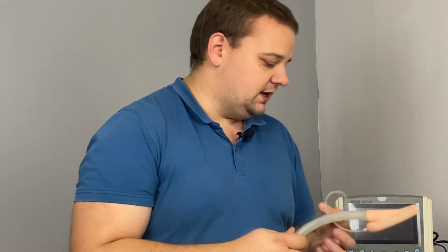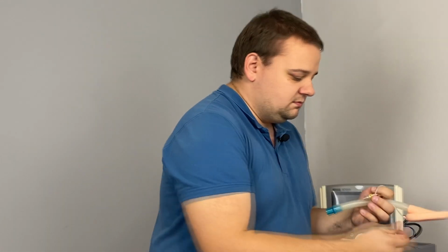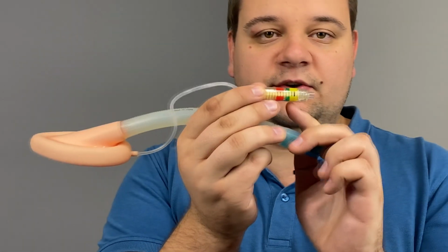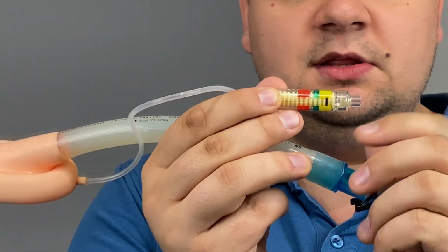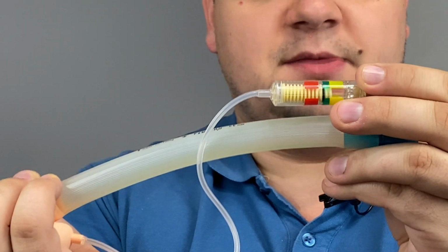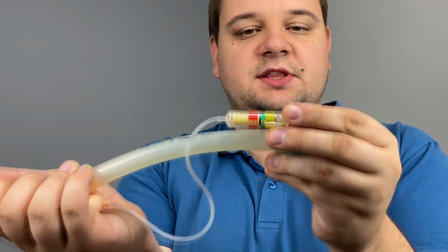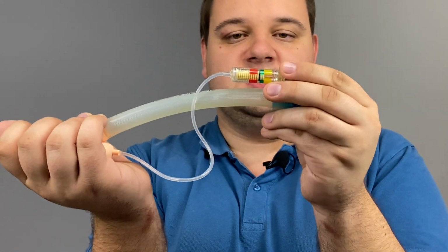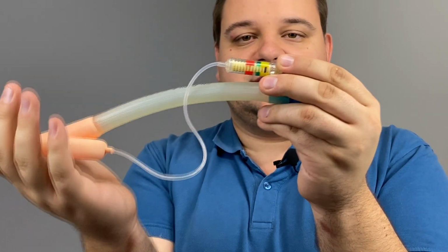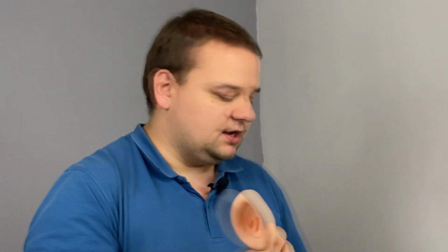Also, our mask has a unique feature which allows us to use it more securely. So this is a pressure controller, and you see that it has 3 colored levels. So green is the ideal where we are going, and when we start to inflate it, when we're inside the patient, so let's imagine it's compressed somehow, so this pump must stop at the green stripe, so that means that the pressure is okay for the prolonged stay, so the patient will be safe. If the pressure is too high, we'll see something like that, so it will be completely compressed. And in normal relaxed condition, you see that it's on the yellow level, so nothing is compressing and there is no pressure on the distal part of the cuff.